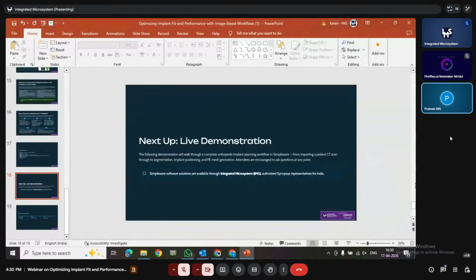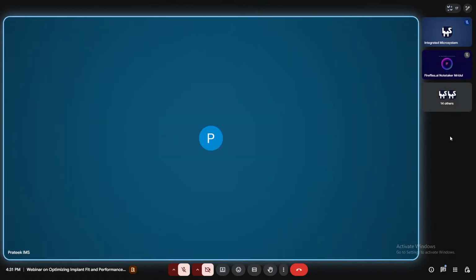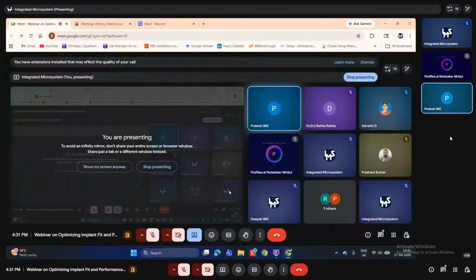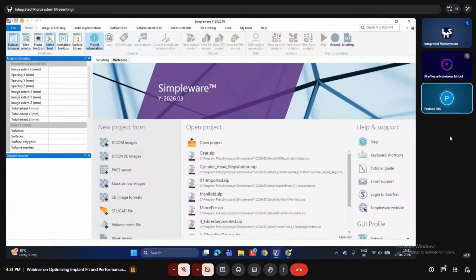So let me share the screen now. I hope my screen is shared, and I'm going to open this software.